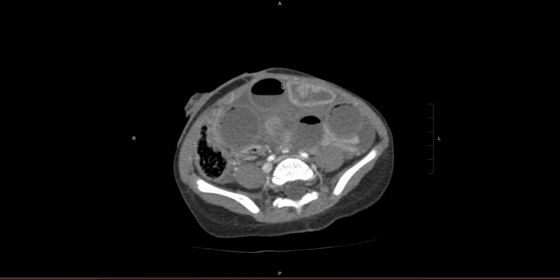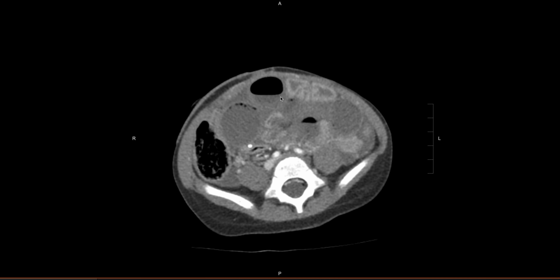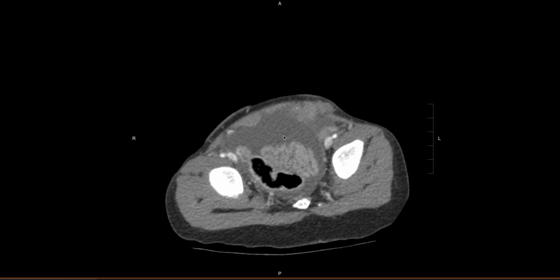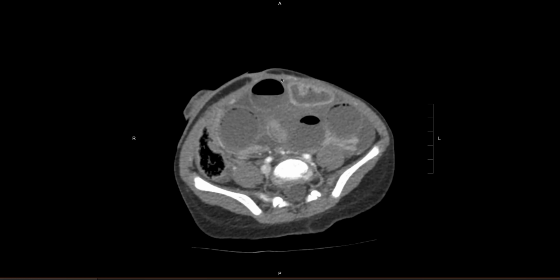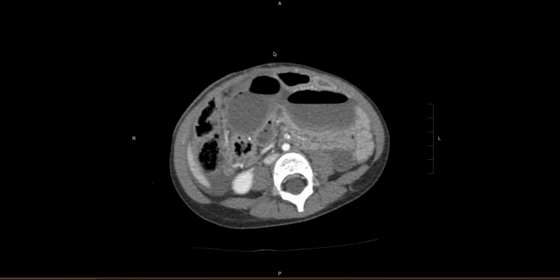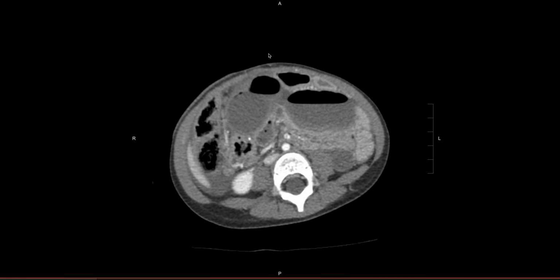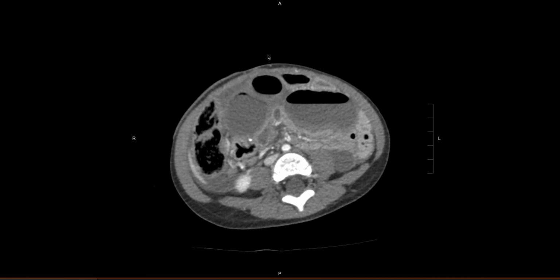And if we look on the axial, I would argue that some of these areas are very indistinct, potentially not enhancing small bowel or heterogeneously enhancing. This wall we can see, this one we can't. Bunch of fluid, inner loop fluid, so this is very suspicious for extensive edema, inflammation, presumed to be ischemic given the mechanism of closed loop.